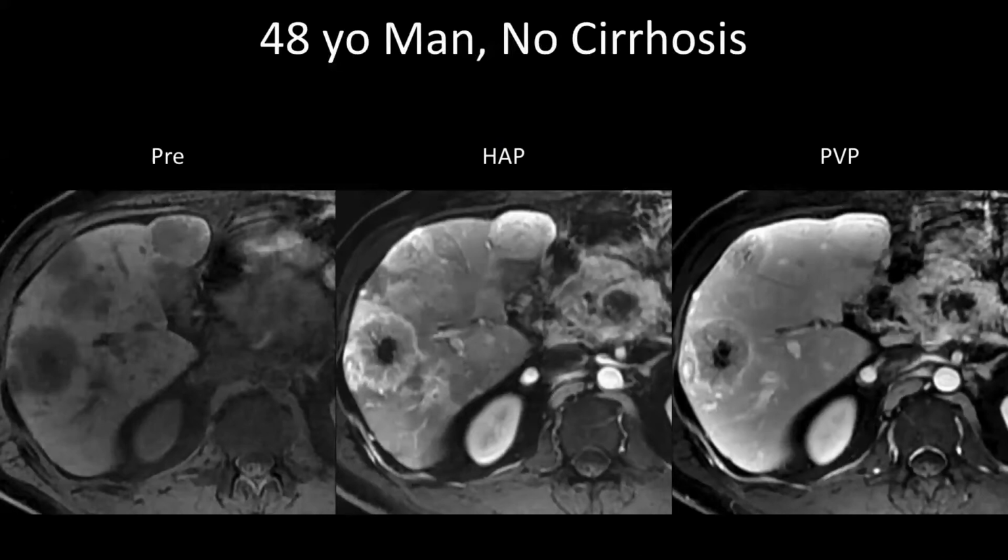I draw your attention now to the arterial phase, and we see that there's a mass in the liver that has rim enhancement along the outside. So this is what we mean by rim enhancement. And this particular mass has an area of non-enhancement centrally. And notice that this area of non-enhancement centrally does not enhance on the more delayed images. So this central area is necrotic. That's why we have rim enhancement in this particular case, because the viable tumor is on the outside, the necrotic tumor is on the inside, and the enhancement can't get in there.